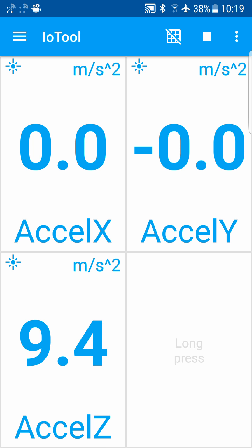So what now? We can clearly add additional sensor readings or even a result from a trigger or action. But what if we wish to have more than 4 buttons? We can add more buttons to the dashboard. Just select your drawer.